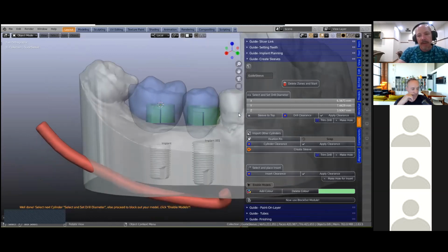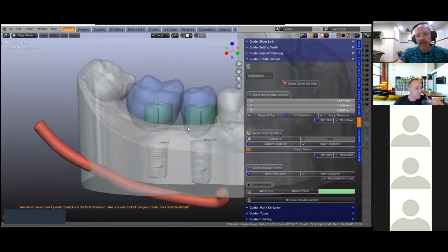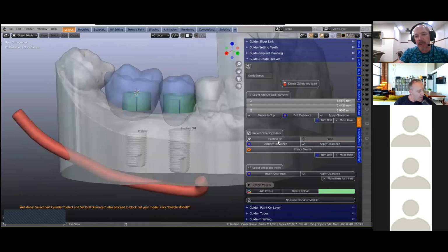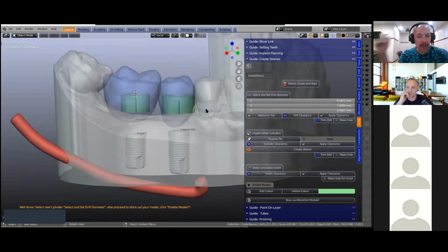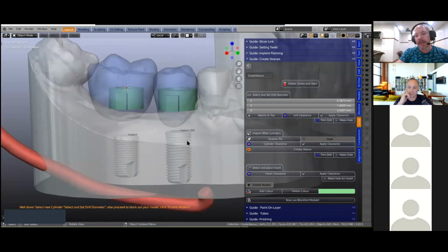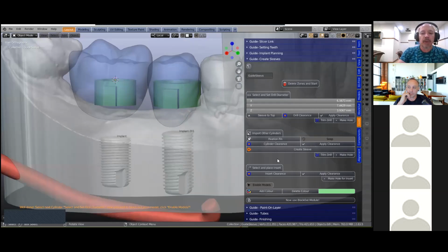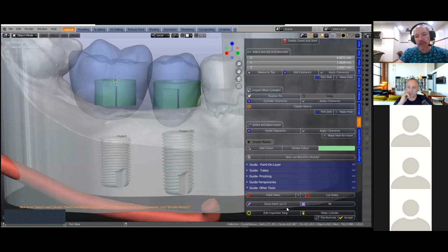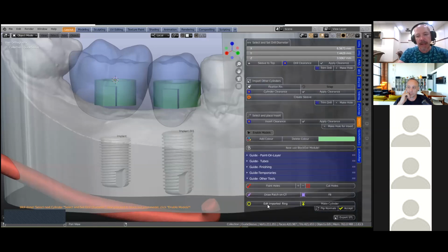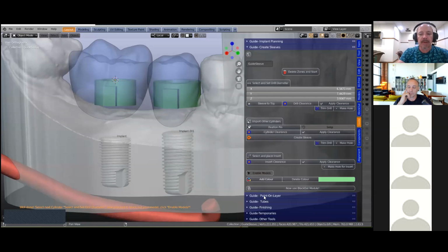All right. So we've done this. We've got fixation pins. I'm not sure whether I should discuss that now. I think we should just continue. We've got the video on that, and if you're importing cylinders from a different program, like Blue Sky Bio or other ones, you can work with the cylinders here, or we can work with them at the bottom. There's another section here, and the other tools here with the edit imported rings. So we've got a tutorial on that as well.